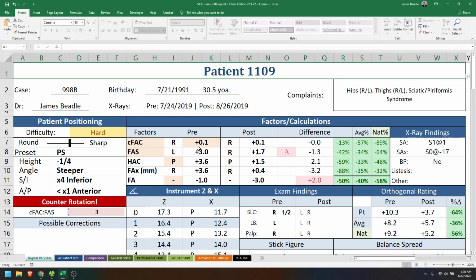Through collecting all the stats, we have noticed that if any of these are less than 1 degree, we have a very hard time controlling that particular misalignment. So it highlights there just so you know, be extra cautious with this particular case.